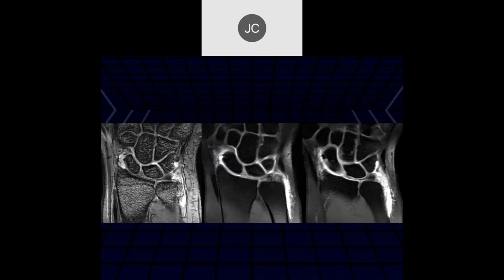It's a 1.5. I think I see the scapholunate ligament is intact. There's some increased signal within the triangular fibrocartilage. And there's a little bit of contrast here, a little bit of contrast going through the scapholunate interspace there. Yeah. And this turned out to be a surgically confirmed lunotriquetral ligament tear.